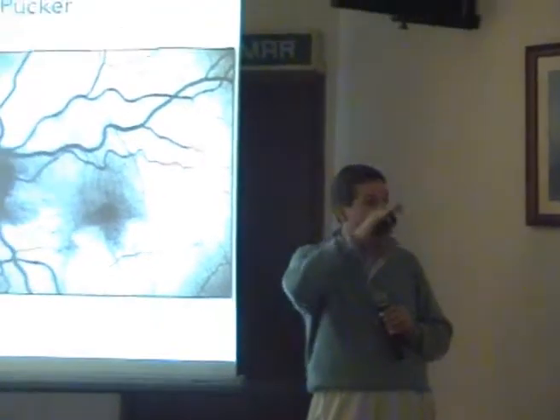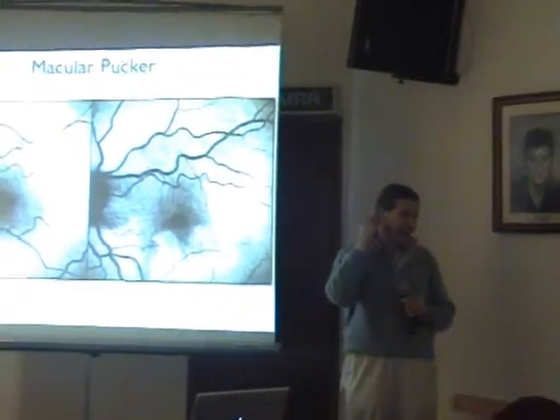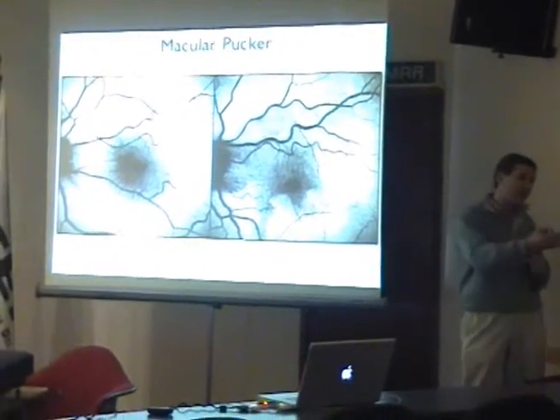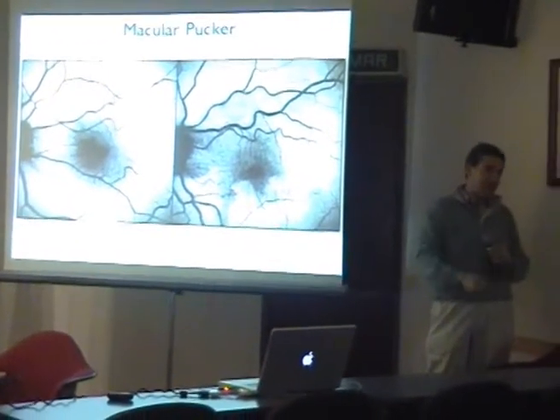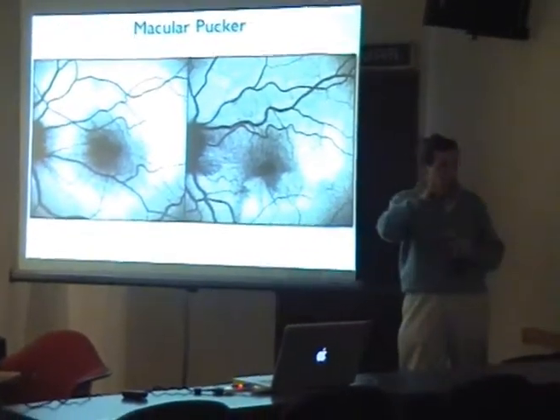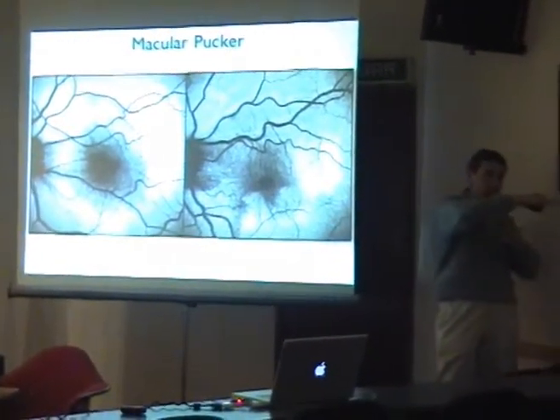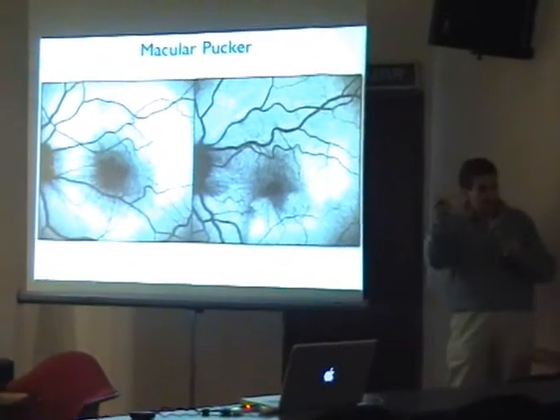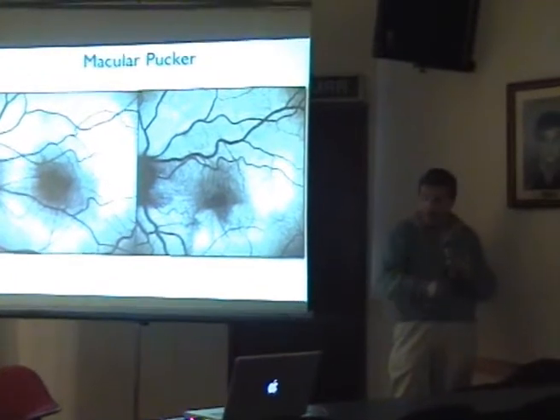And so it's like a window defect. The problem is that now we have the Spectralis, and we can actually look really at that point because we can overlap the line of the OCT compared with the side-by-side image in real time.